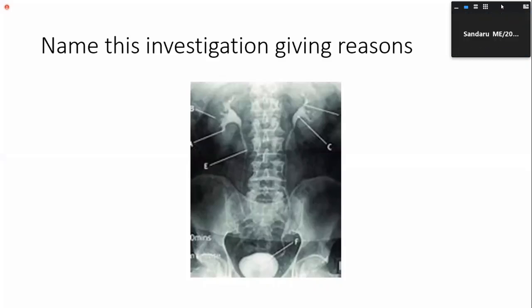The ureters are visible, sir, and they are not dilated. There is no reflux. The kidney shadows, it will be dilated, sir. Okay. But these ureters are not dilated. Okay. Kidney shadows. In an MCUG, the bladder will be more rounded, right?